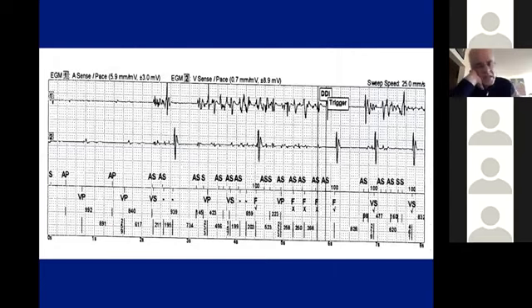All right, so here is another example of noise. And here maybe somebody from the audience can help me with that a little bit. This is the atrial channel up on top, then the ventricular sense channel, and then markers. So what kind of noise are we seeing here? And is it noise, first of all?